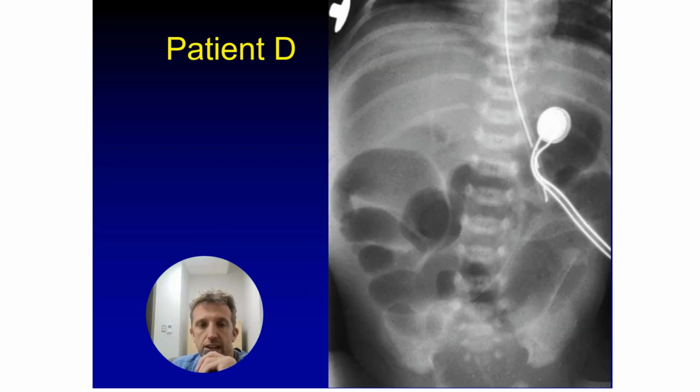Okay, what about in babies? This is a newborn. So let's do lines and tubes. Enteric catheter going in the stomach, that's good. Bones, I don't see any fractures. No mass or mass effect. How about the air pattern? We're going to look for free air first. Do you think this baby can stand? No. They are on their back.